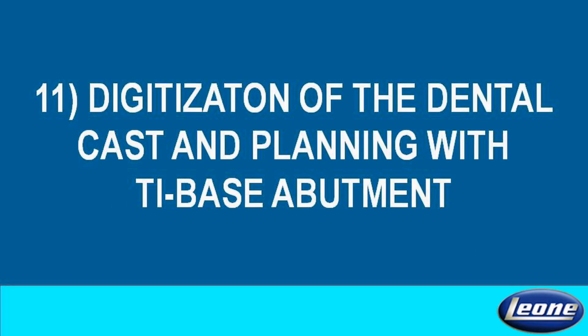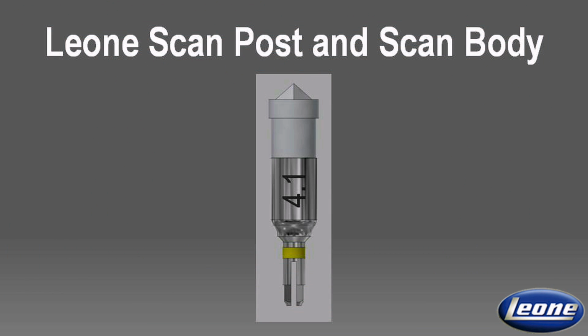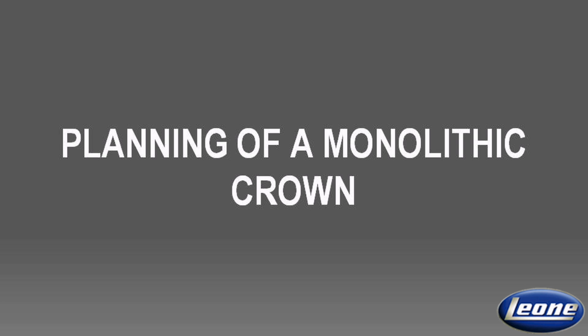Digitizing the dental cast. After having a traditional impression and prepared the dental cast, the scan post and the scan body are placed into the analog in order to capture the implant position. Now we start the software.